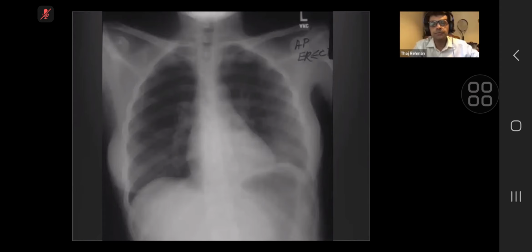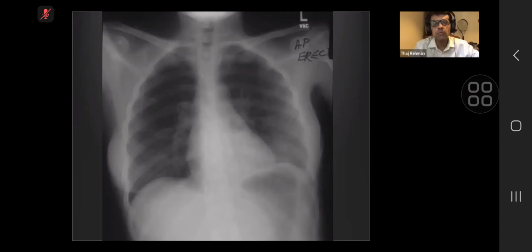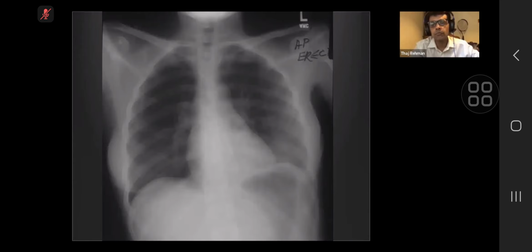So I've got an AP radiograph in a skeletally mature patient, with a central, normal heart size and mediastinal contour. Both hilar points are at the same level. There's an opacity projected over the left hemithorax, lower lobe. And I can see breast shadows on both sides.